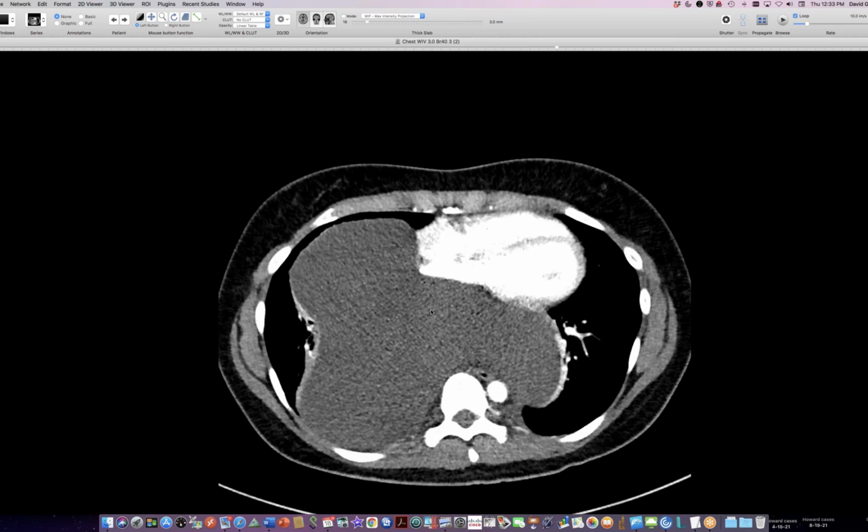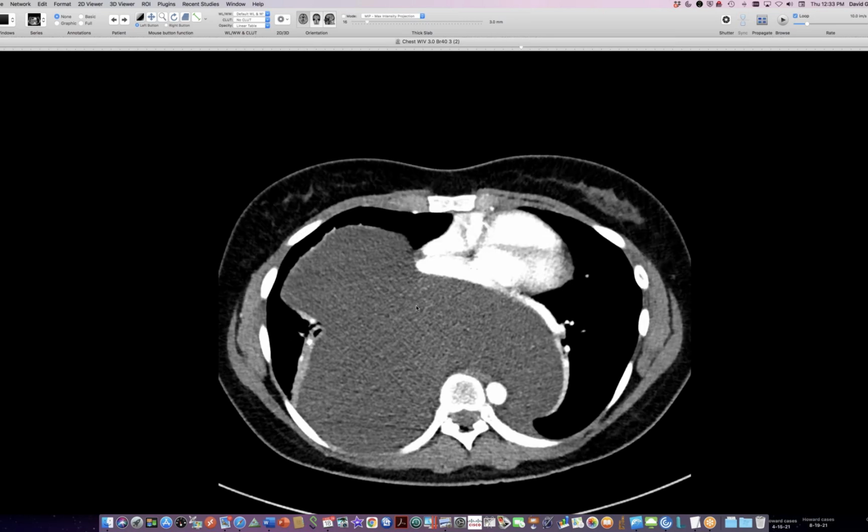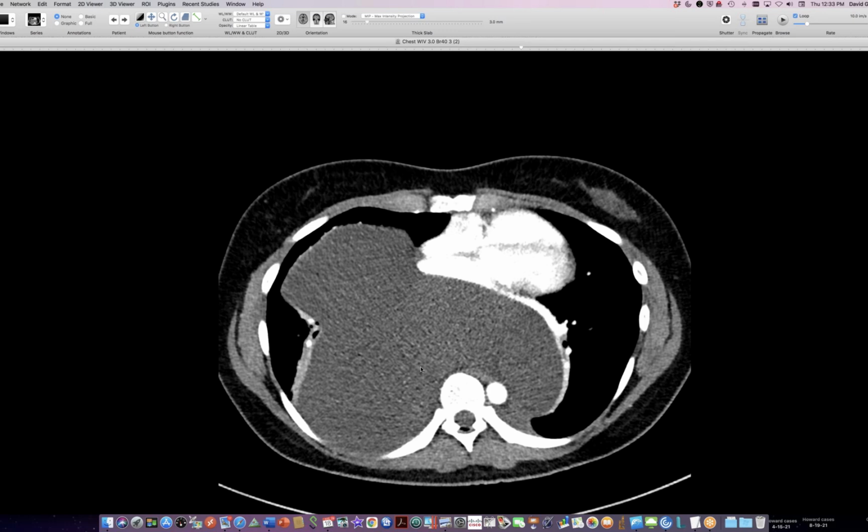Yeah. So this turns out to be lipoblastoma, which I talked to the pathologist about, and the pathologist says lipoblastomas can be fat poor. So they can have no fat in them, no macroscopic fat, but they're still made up of fat precursor kinds of cells. And they described this as myxoid. The pathologist described this resected specimen as myxoid, which accounts for the low CT numbers around 20, but they didn't describe it as fat containing.